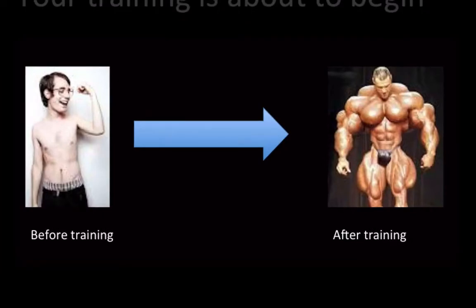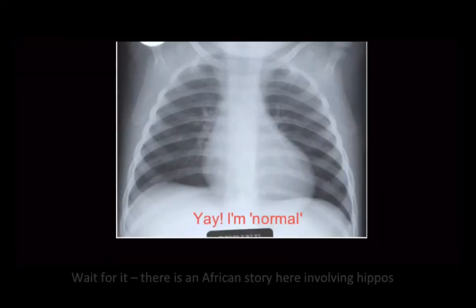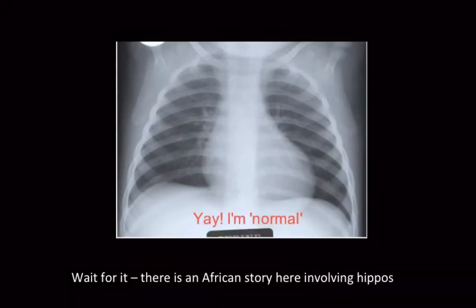Your training is about to begin, and I expect you to look like the after training picture once we're done. This is a normal chest radiograph. It's done AP, and I want you to note that the arms are up. And this often helps those people taking the chest X-rays in children to get a better X-ray.